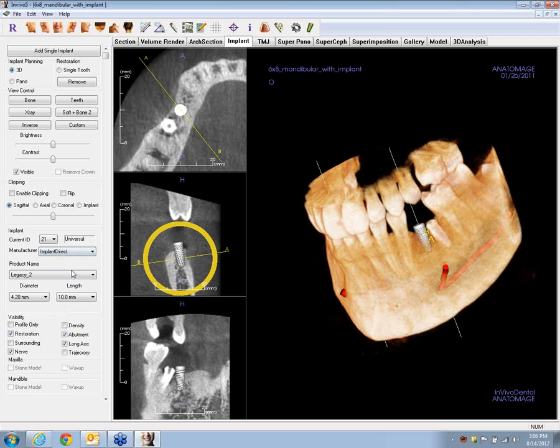The other thing is that we can go ahead and set up our preferences so that we always are able to drag, as the first line of defense here, the implant that you would always lead with. This allows you, unless there's some other situation clinically, to show you that you're not going to be able to do it with that implant.